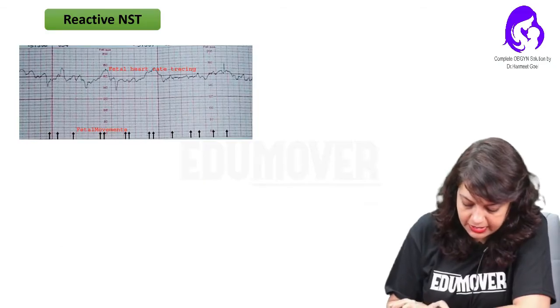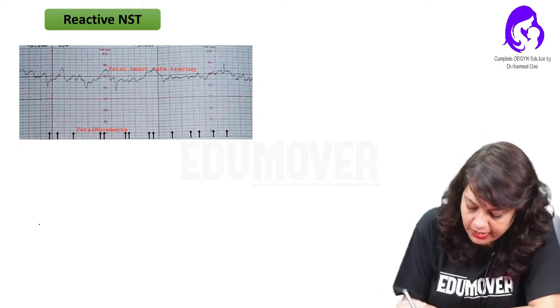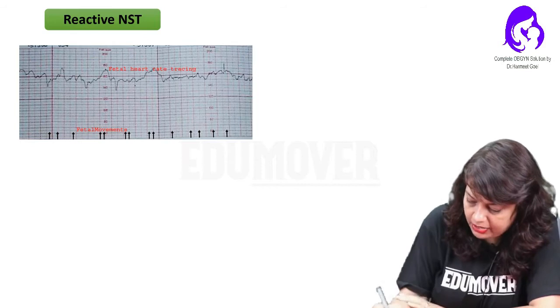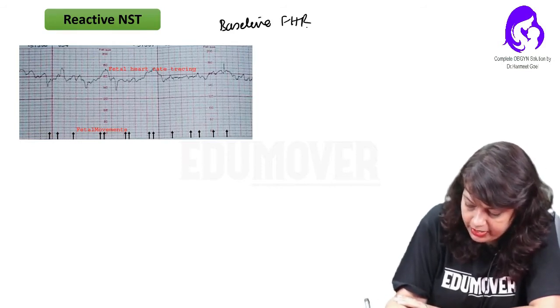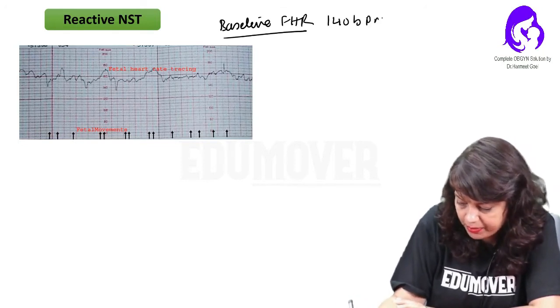What is a reactive NST? You can see the baseline fetal heart rate. Here the baseline fetal heart rate is nearly 140 beats per minute.